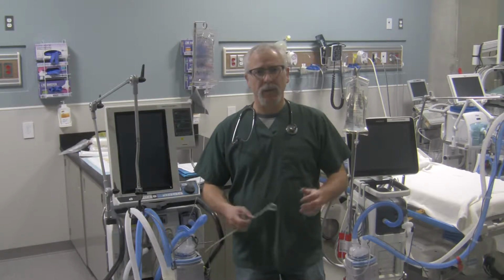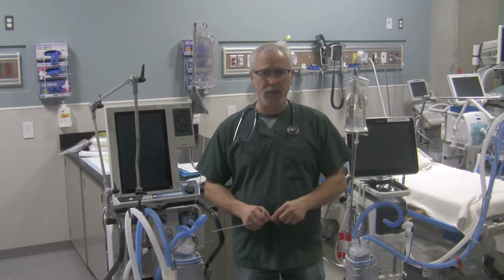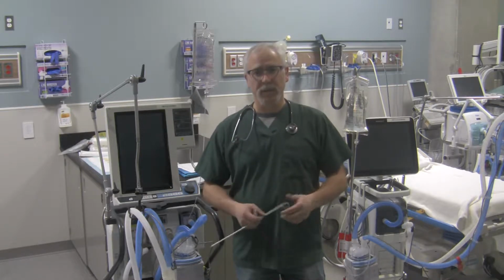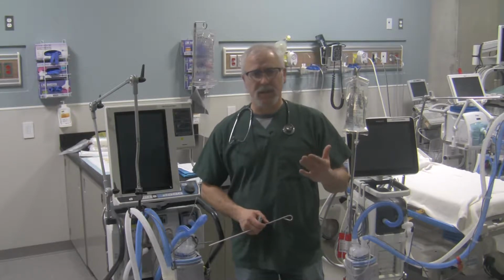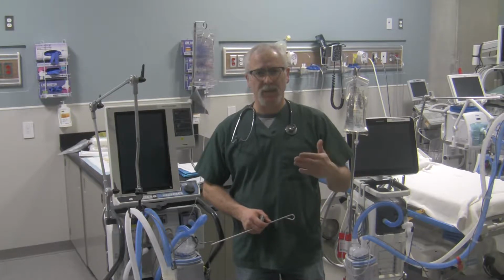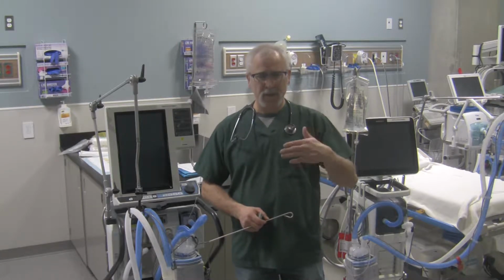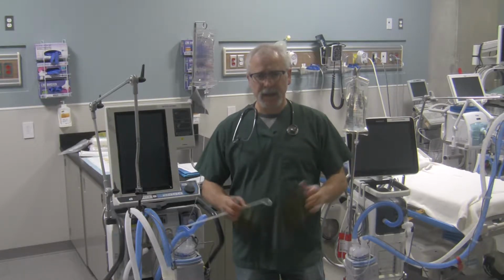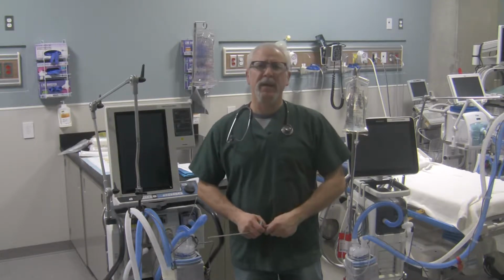Anyways, what we can look at a ventilator being today, and what it has been over the last number of years, is simply a machine or a mechanical device that takes over the patient's breathing when the patient's no longer capable of breathing themselves. So from a life support perspective, the ventilator is looking after the patient's breathing when the patient requires life support. In terms of life support in the intensive care units, this is the ventilation aspect of life support. So what are some of the main components that you'll see on your ventilators?